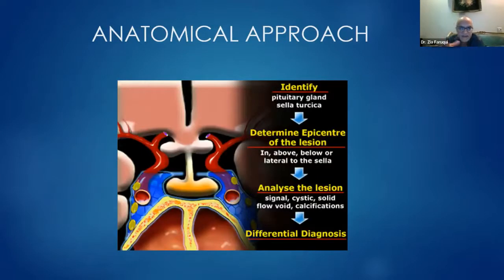Now, these slides are basically from a radiology side, but I thought this was a very good depiction of an approach to the pituitary gland. So again, here's our anatomy. This is the pituitary gland. This is the infundibular stalk. This is the optic chiasm.